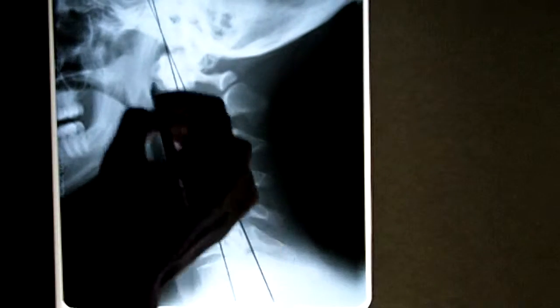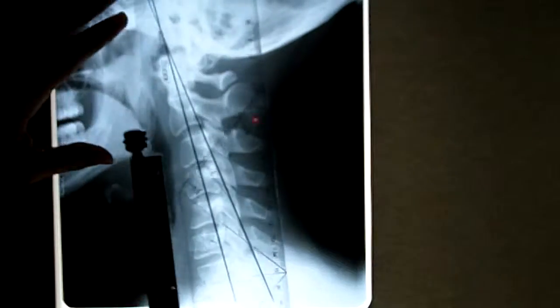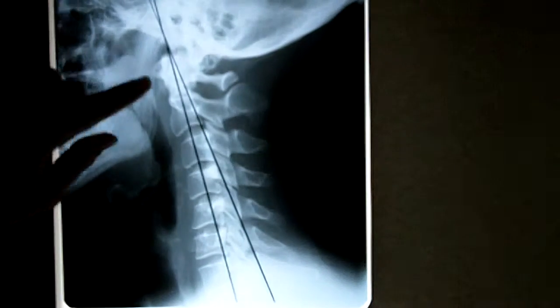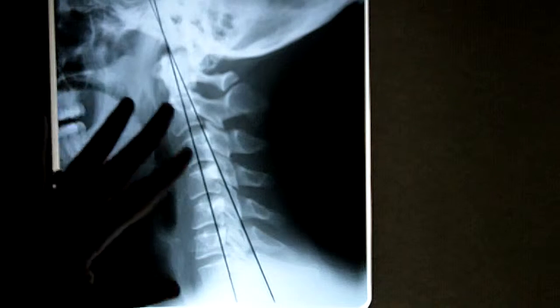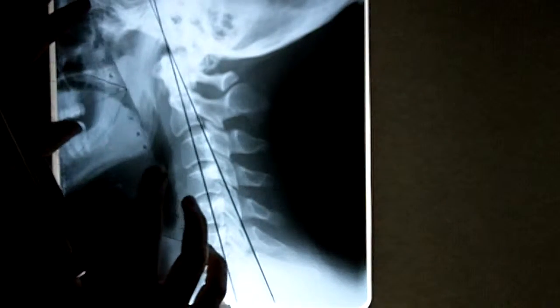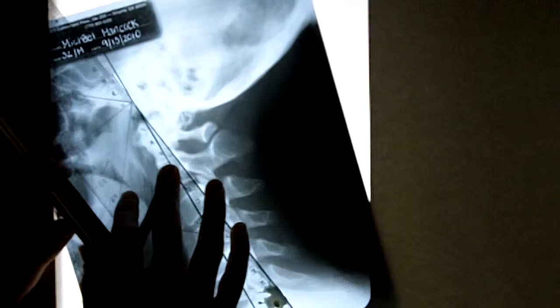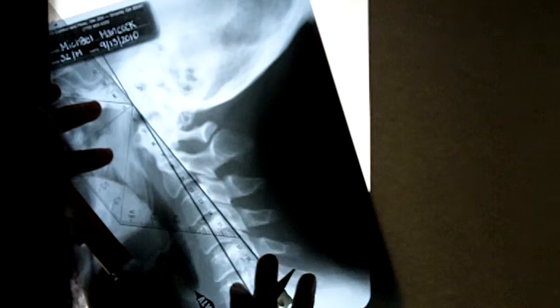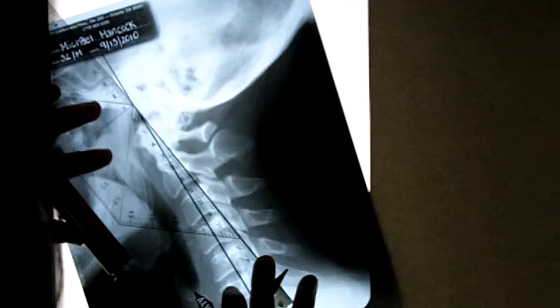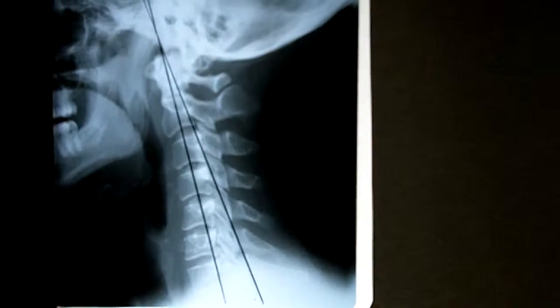Now, as you can see, these two lines barely intersect, so you're going to make sure you get where they converge. And this is a negative curve, so when you read it, make sure you mark this as a negative in whatever degrees it would be. Can you go ahead and put the numbers on there? Mm-hmm. And it's -8 degrees.